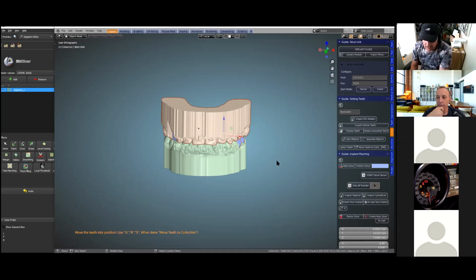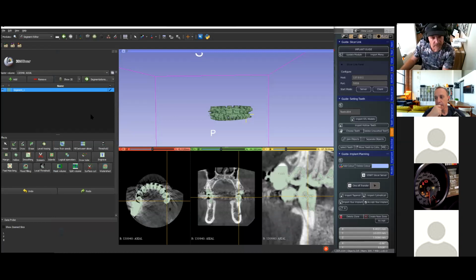Yeah. So we're going to go through to 3D Slicer. As I've said, what we don't need, get rid of. We don't need the segmentation model anymore. So whatever we don't need, we take away, because when we're working with 6 implants or whatever, or even more, you could have a list of 50 objects in the scene, and that can be daunting, and it can also be very confusing. So as we go along, we're cleaning up all the time.